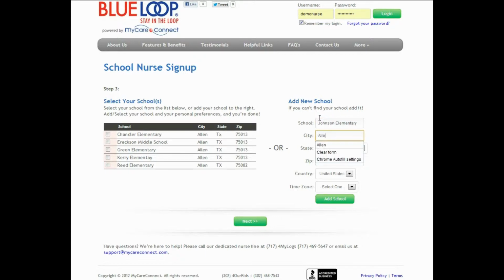I indicate the city as well as the state, the zip code, and then very importantly the time zone so that BlueLoop can set times accordingly. I click Add My School. You'll see now that the school I just added is entered, and I can indicate that this is the school that I am over. Now if I'm in charge of two schools, I could check another school as well, and that gives me access to both of those schools.